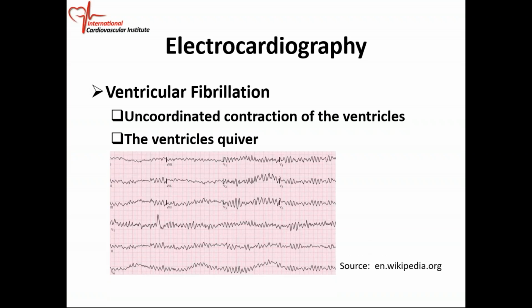Okay. So this is what ventricular fibrillation looks like. Just look at the rhythm strip. So if you see something looking like this, make sure it's not artifact. If you see something like this and the patient is talking to you, don't shock the patient, please. Okay.